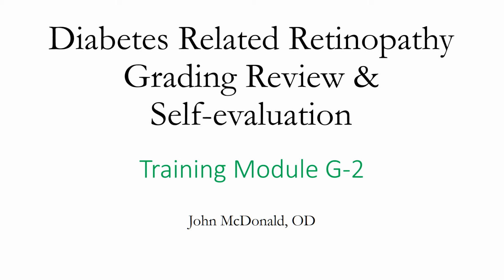This is part 2 of a 2-part training module. The first module reviewed the retinal image evaluation and grading of diabetes-related retinopathy. Part 2 is a self-paced learning module to improve individual grading skills by evaluating images.